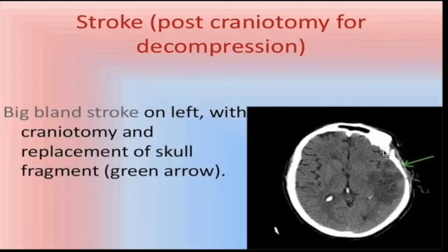So here, this is showing us a patient who had a stroke, and it's post-craniotomy for decompression.